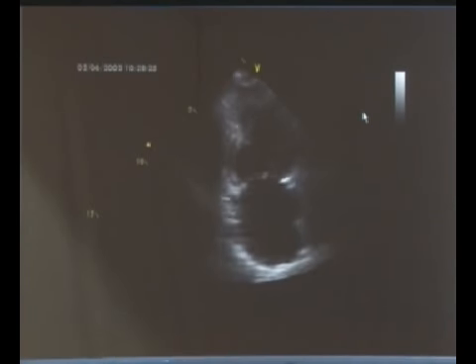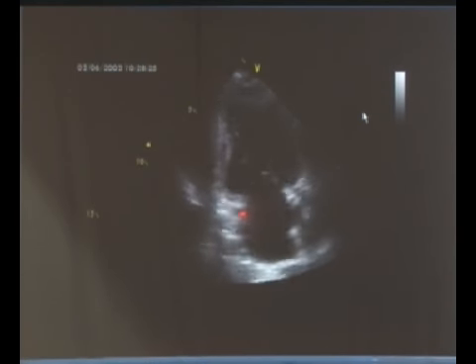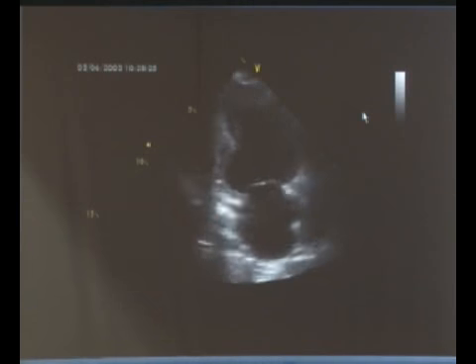Is it an aneurysm? Because in diastole also it is not. You look during diastole, it's straightening up. It does not remain in the same form during diastole. And I'll show you what an aneurysm is now.